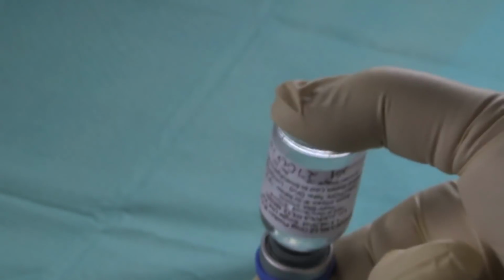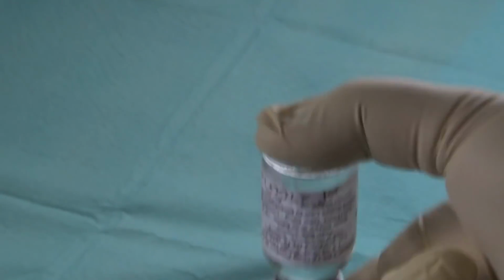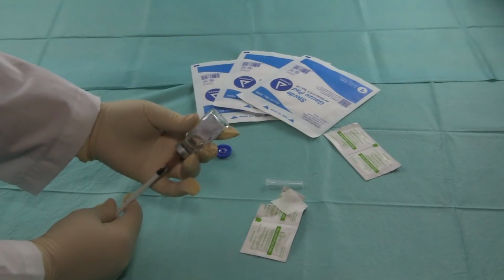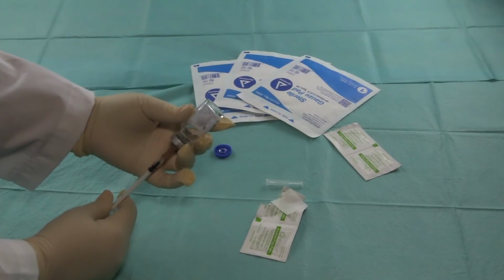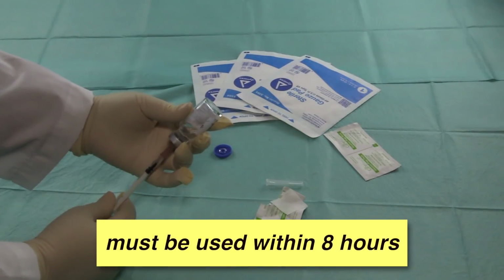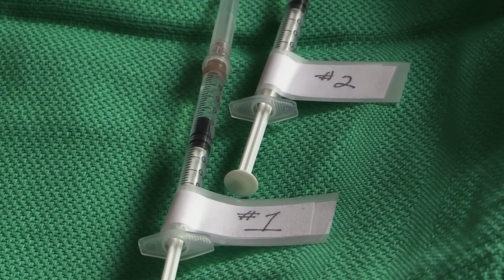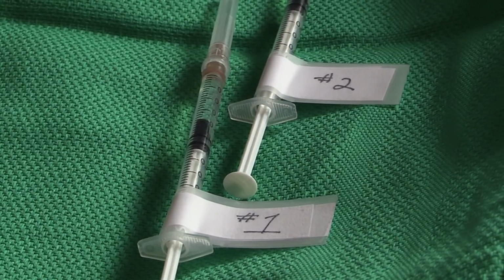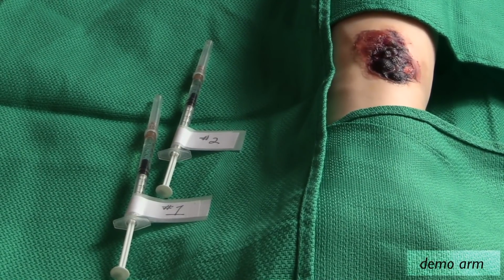Once the plasmid is completely thawed, invert the vial several times to ensure proper mixing. Select the appropriate syringe based on the plasmid volume and draw up, using sterile procedure, the required volume into the syringe. The plasmid is stable at room temperature but must be used within 8 hours of preparation. Once the patient has arrived, the plasmid can be placed in a gel pack and cloth for transfer to the treatment room. The study coordinator will deliver the syringes to the patient treatment room.